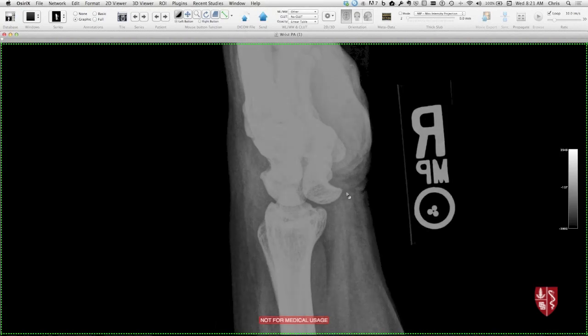I didn't put it in here, but the lunate, if it loses all its ligamentous attachments, can actually migrate quite a bit. So I have a different case that shows the lunate pops out. It's actually migrated well into the proximal forearm here. So that's a higher grade ligamentous injury, typically acute, and requires surgical fixation to get things to heal up.